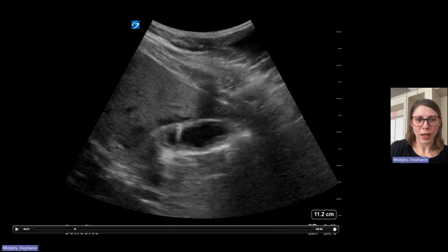So what's happening is they get these little outpouchings. It's a hyperplastic condition in which epithelial-lined outpouchings form within the gallbladder wall, and they can collect bile, sludge, or cholesterol crystals. It could be focal or generalized wall thickening. And the ring down artifacts from the cholesterol are really common.